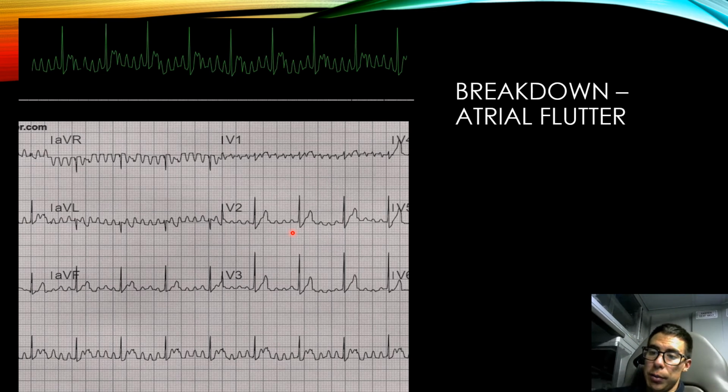And so now we're going to determine, even though we already know what this is, and I just said that means it's coming from the same part of the atria, but just for getting in good habits, since in real life we won't know what this is right away, or we might not, at least, we need to really get used to those steps of interpretation and practice them. So we've identified there's P waves and there are extra ones that are monomorphic.